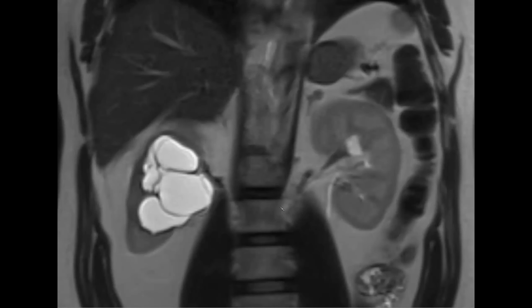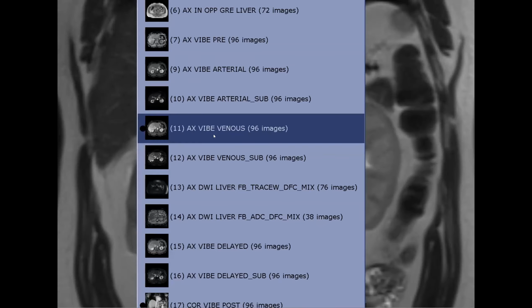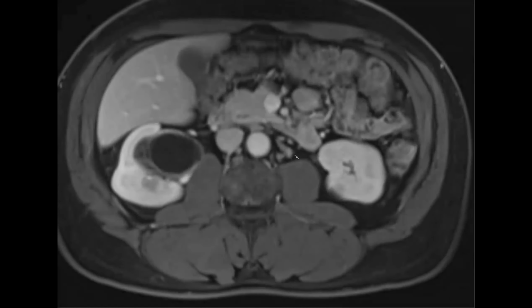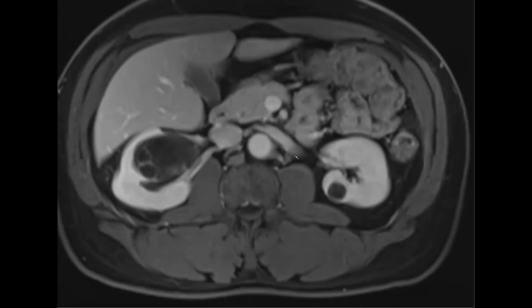The only thing, and again this may be incorrect, is that in the corticomedullary phase, cystic RCC, all the septa and everything, hyperenhance very well, whereas MEST enhances a little bit less, but it's not very reliable. So there's an overlap there. Clinicians in my institute, if it is a solid renal mass, there is a chance it could be an oncocytoma or a fat-poor AML, so they biopsy it.